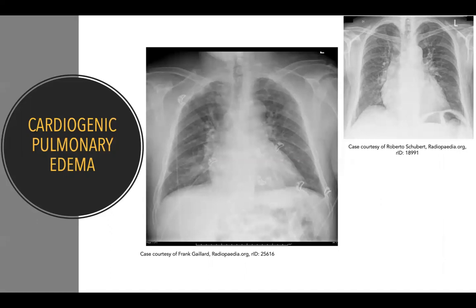This chest X-ray is of a 40-year-old male with a recent diagnosis of acute renal failure experiencing shortness of breath. Before looking at the anatomic features of this radiograph, take note of the number of the EKG leads on this patient. And there appear to be more posterior and to the patient's left. If you're examining a chest X-ray on a patient and there is limited background information available, just noting features like this 12 lead can clue you in to what to look for or what symptoms the patient may have been experiencing. Now, let's look at the features of this chest X-ray that suggests cardiogenic pulmonary edema.